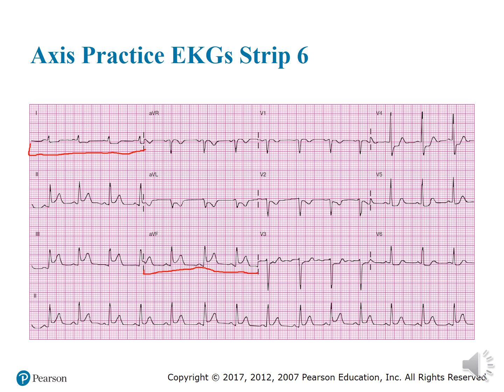So we're trying to determine what the QRS is doing. Well, in this one it's going up, because you'll take Q, R, S. And in this one it's going up also, because you would take Q, R, S. So we would say this is normal. It just happens to be that both of them were normal that I picked. It wasn't intentional, it just happened that way. So this one would be a normal axis deviation.